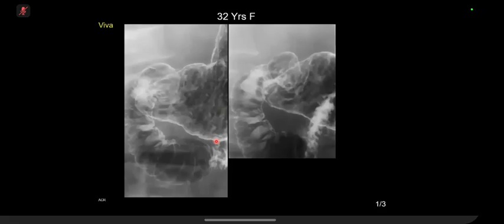Yeah, so within the generally irregular mucosa, there are small areas where there's punctate pooling of the contrast with a surrounding less dense area. They're multiple and they're small in size. They look like ulcers and they have the characteristics of aphthous ulcers.